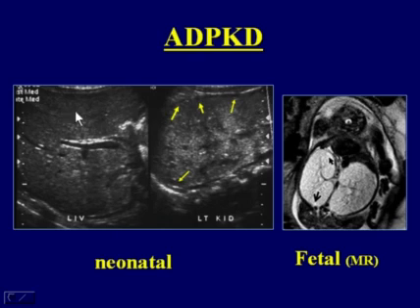This liver was normal, had no evidence of biliary ectasia, whereas there were multiple small, somewhat sonographically resolvable cysts, actually more cortical than medullary in location. This would be more typical for ADPKD, as it was in this baby here, who had a positive family history for ADPKD, mass-like renal enlargement of the kidneys, and multiple small cortical cysts as evidenced by this fetal MR.